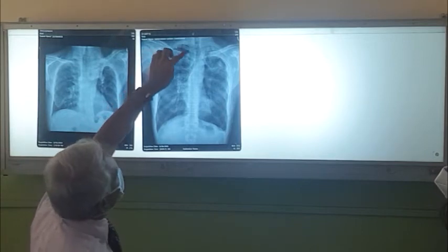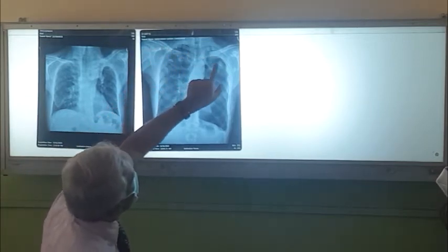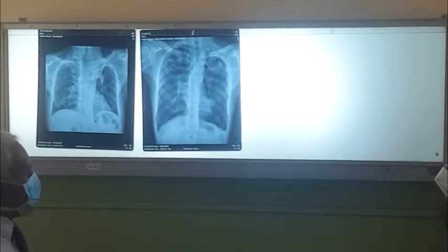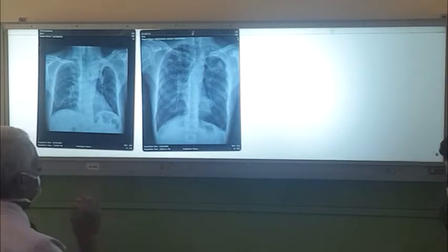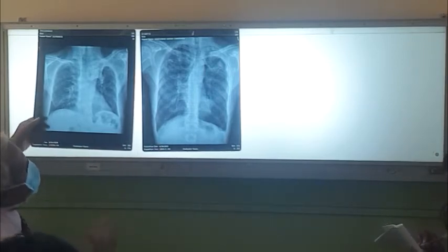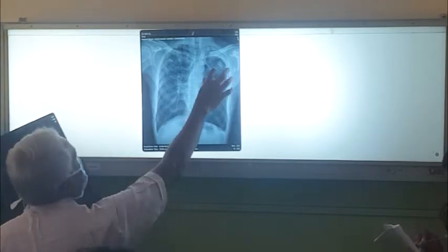So these are all cavities, and there's a pleural thickening here, and this is a cavity with an intracavitary body. So you have to think of mycetoma. Patients with TB, when they are cured, later on they can come with hemoptysis, and you have to do an X-ray and see whether they have mycetoma in addition to reactivation, right? Mycetoma and malignant formations.